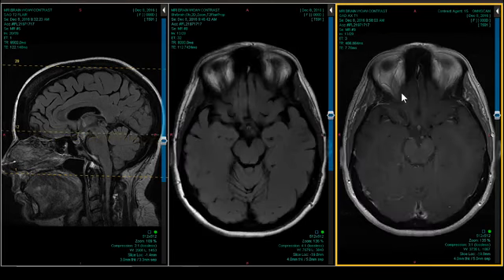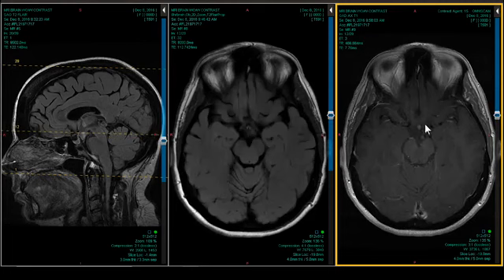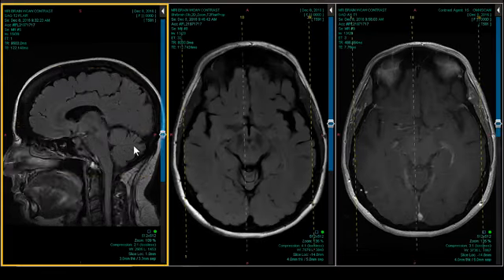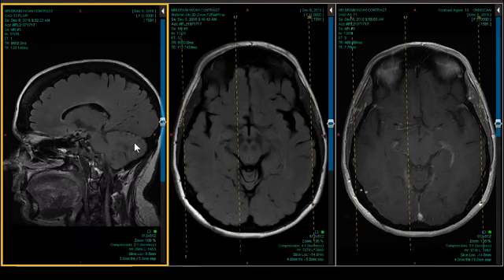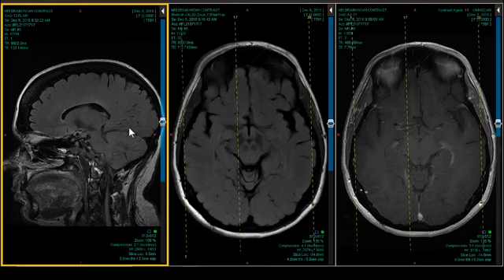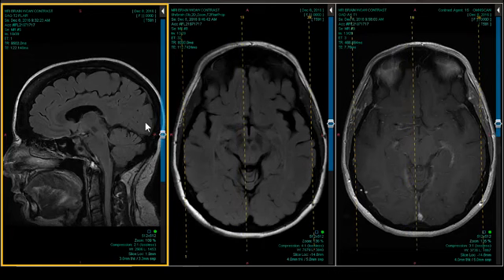And you've got the optic nerves, the intracanalicular optic nerve. They meet at the chiasm. Then you've got the optic tracts. Here's the lateral geniculate nucleus. Here's the superior colliculus. Then you go into Meyer's loop, and the striate cortex, and the calcarine cortex is right here. You can check out your sagittal and see if anything's happening in the occipital lobe. Here's the parietal occipital fissure. Here's the calcarine cortex. And it looks peachy, actually. It looks fine. There are no infarcts back there, and there's really no atrophy back there.